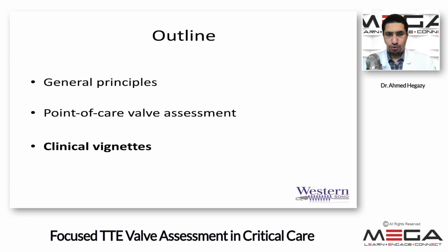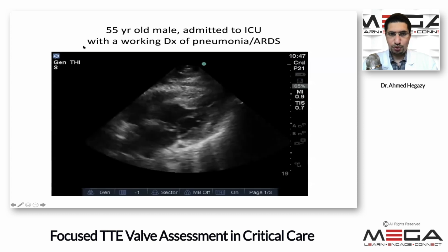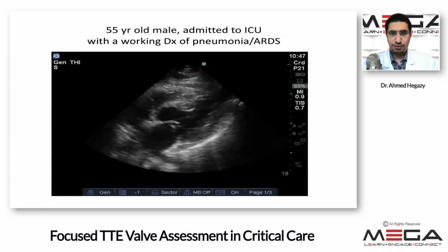So let's go through some clinical vignettes. I don't have too much to go through here, but I will go through a few clinical vignettes where ultrasound actually helped in the ICU navigate patient management.